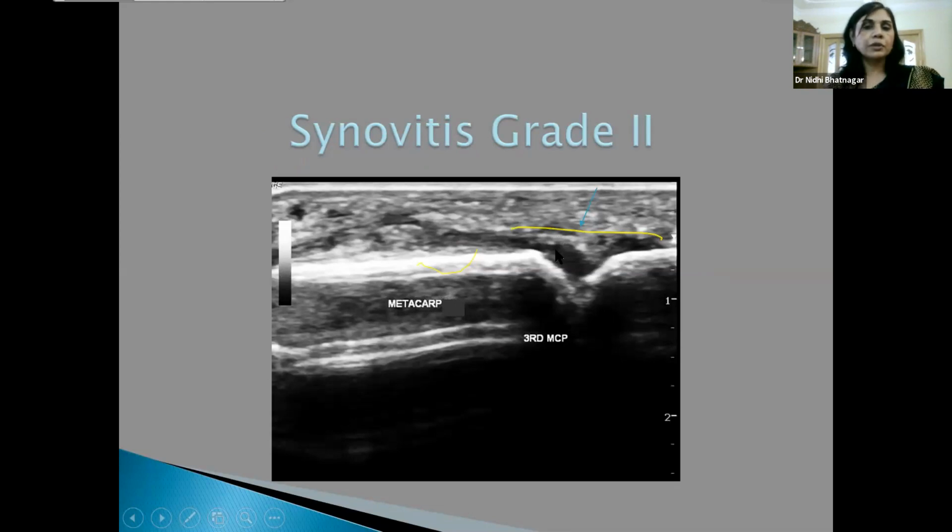And on the smooth volar surfaces, there appears to be a small erosion that has started developing at the level of the proximal phalanx, but the cartilage seems to be sort of maintained, with a bit of irregularity. But this was done by a 12 megahertz probe. Had we had a higher frequency probe, maybe 19, then we would have been able to really justify whether there is a cartilage erosion, cartilage irregularity, or loss of cartilage at this point.